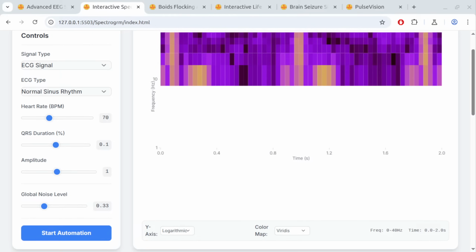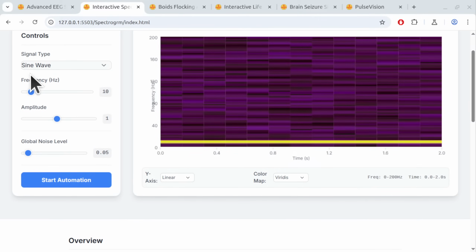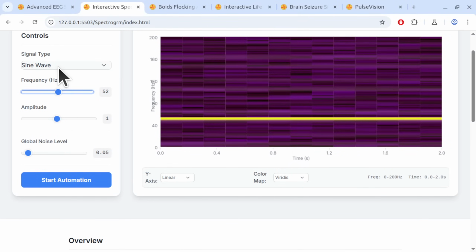Okay, so we have the code working. Yeah, it seemed to be well, linear, logarithmic. Yeah, so now we have more high resolution on the frequency on the y-axis. Yes, the developer has successfully increased that. The enhanced frequency resolution provides a much clearer view of the frequency content, making the spectrogram more detailed. Okay, we have 773 lines of code. Okay, let's test it real quick.